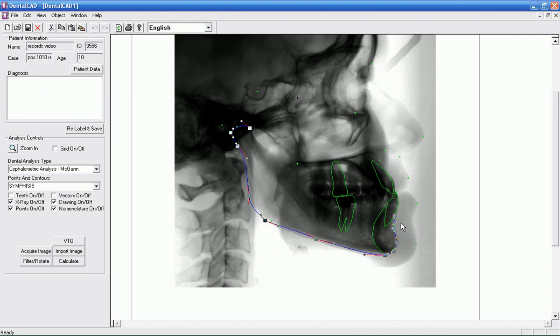Alright, now what I'm curious is when I hit it again, what's going to happen? Okay, hit it mandible, and now I'm on to the lower. When I click F2 a second time, it moved over to the lower profile. So it started at stomion, went tip to the lower lip. The third point on this lower profile over the chin is called the sublabial point. And notice that I placed it at approximately the height of the apex, this little sublabial point.